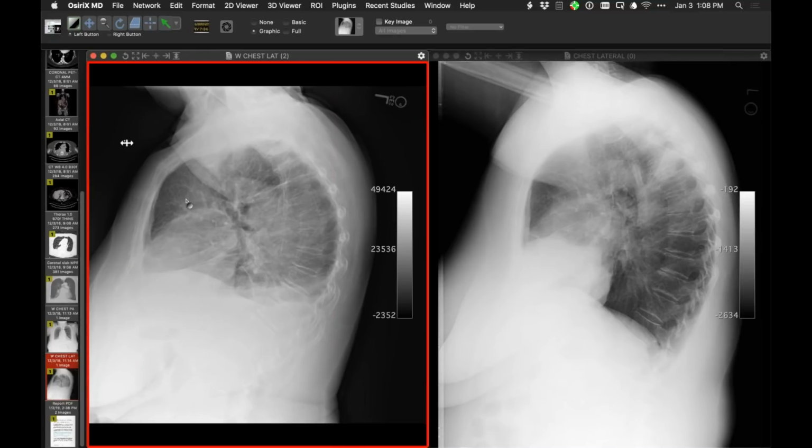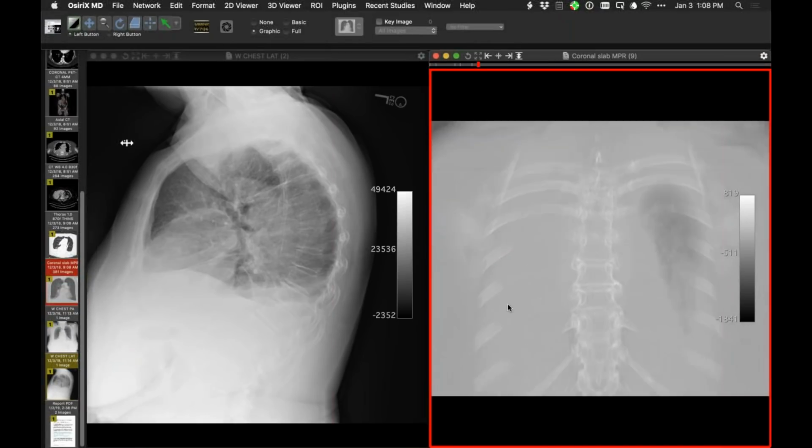Of course, it's often hard to see abnormality in that location in the mediastinum on the lateral projection of the chest. But I'm hoping that as I've been talking, Travis can make another observation, or David, in relation to where substantially abnormal opacity is present, and it's not here. Yeah, it's over the spine and more posterior. Exactly. Very good.